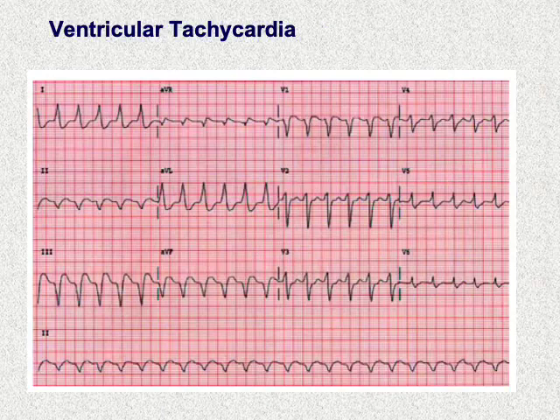Now to ventricular tachycardia, which is again a tachycardia. As you see here, the interval is around 2 large squares, that is a rate of 150, and it is regular again, but the QRS complex is wide. So it is originating from the ventricle, so it is not atrial or junctional, it is ventricular tachycardia. If you have a narrow complex, this is supraventricular tachycardia.